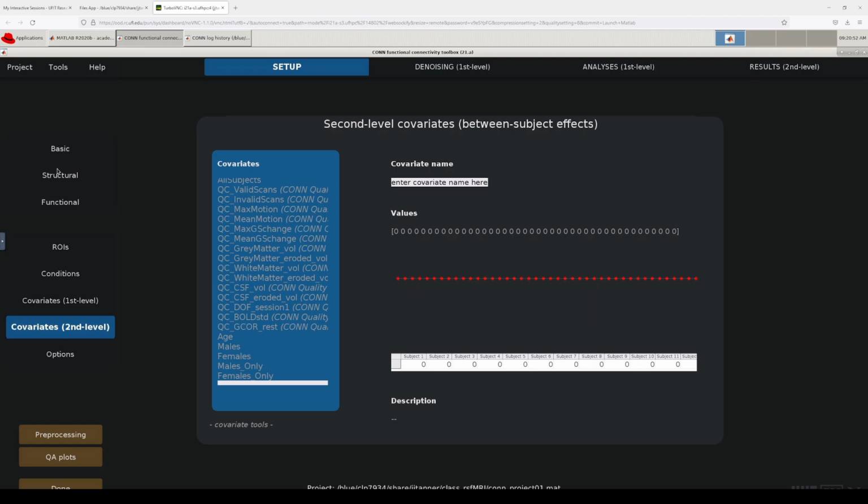Again, this is a virtual computer that's being run. HyperGator would end the job for running out of time, and then that's it. And if you haven't saved your work, then it's lost. So I save, and each step tends to save automatically, but in something like that, we need to do this saving. Okay, now we are going to look at the results.